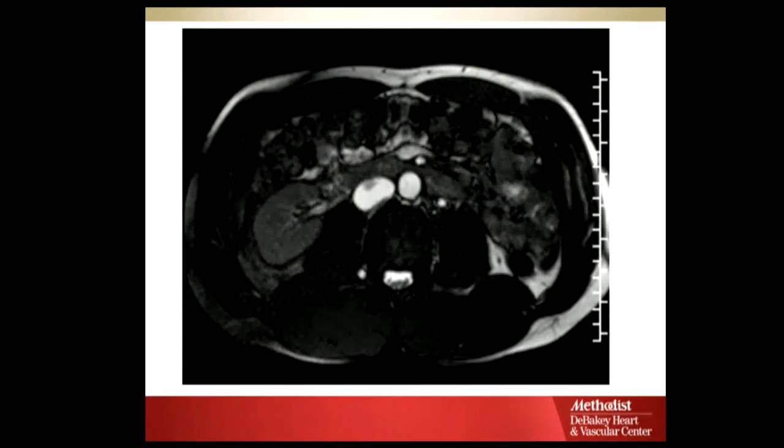Looks like nutcracker. There you go. Maybe. Is that a nutcracker? Is that what you're showing here? I don't know what it was, but I'm just showing these dynamic MR scans that we use a lot to look at flow patterns. And see the flow coming into the inferior vena cava and the pulsatility of the aorta. But I think that's what it is.